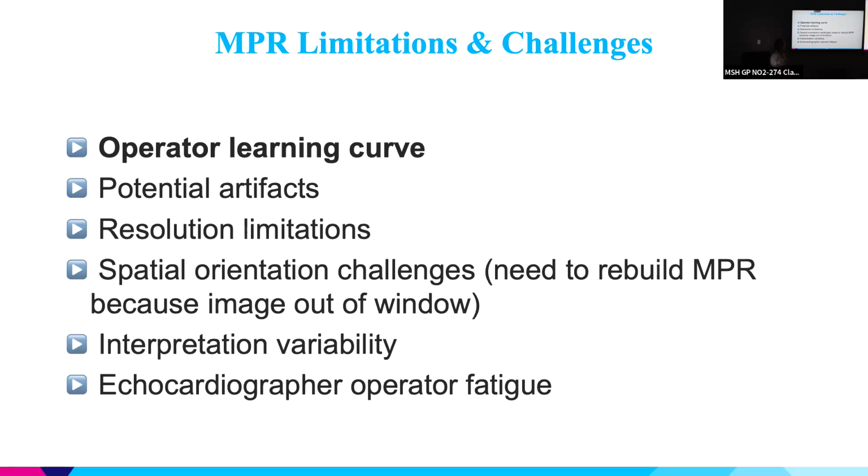Be careful of the artifacts. Learn how to set your gains. Some of that you can't do. Like if the image was acquired wrong, you can't post-process the image better. But if you have a really good 3D image, you can post-process that.